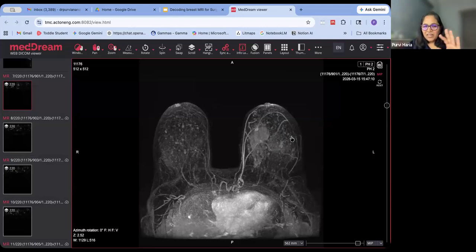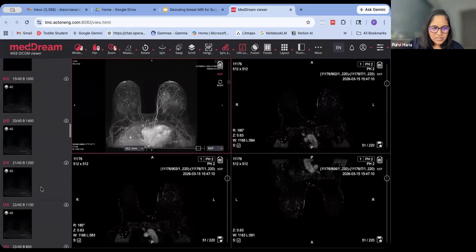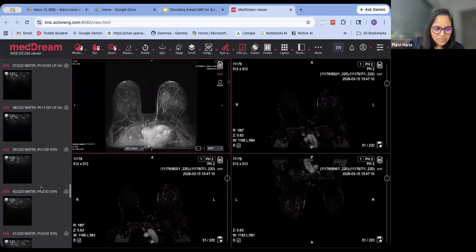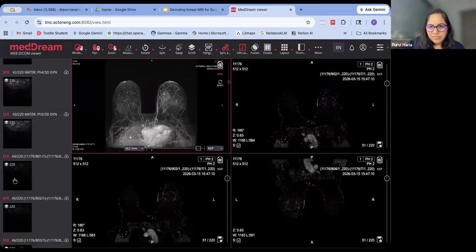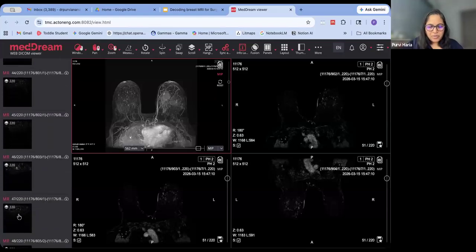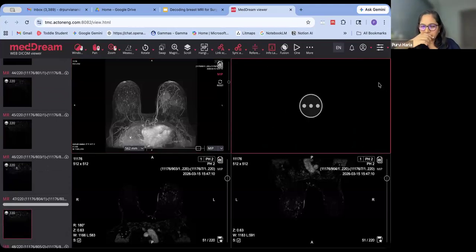So it goes again to the same question of what the disease extent is, or how do I know till where you need to scan, or how much you need to remove. I'll keep this image here, and now I'm going to show you some ultrafast sequences and the difference with what we see on ultrafast images. I'll take the fourth phase of ultrafast because that's where I'm expecting maximum enhancement within the lesion.